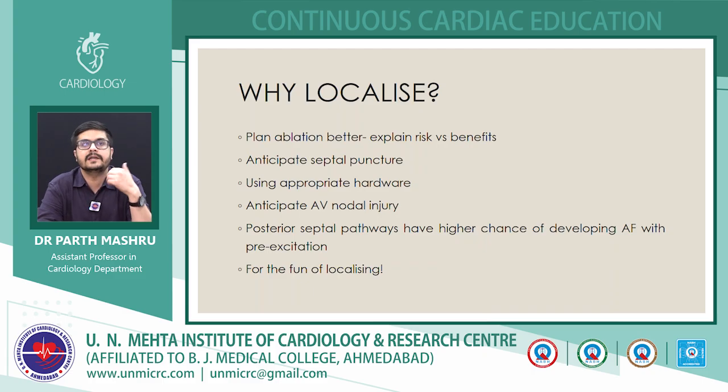So if the patient has pre-excitation suggestive of a posterior septal pathway, the chances of developing AF and sudden cardiac death risk is higher. So even if the patient does not have documented tachycardia, you will still consider the option of radiofrequency ablation in such pathways, because it can be detrimental for the patient if the patient develops AF.